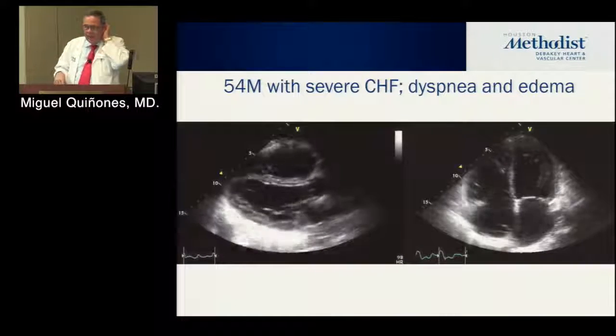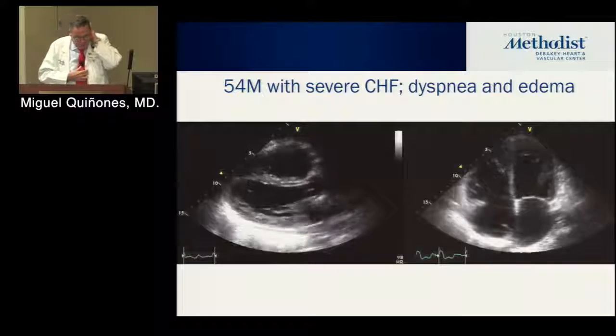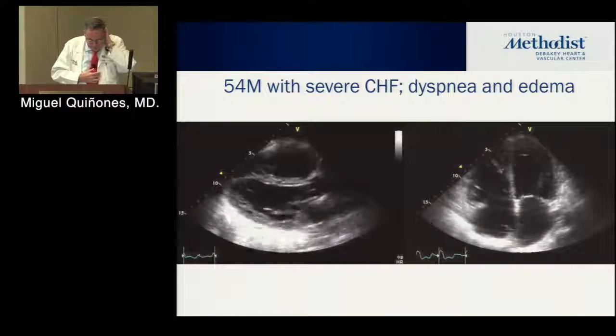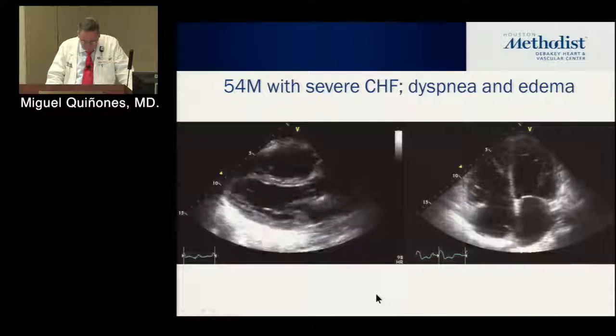In our case here, it would be a nice sentence saying recommend CMR, because now with CMR we can get more specific findings. All right, what about this one? Doesn't look like a healthy guy, right? So we have biventricular failure, biatrial enlargement, lousy EF on both ventricles. Okay, so what else do we have?